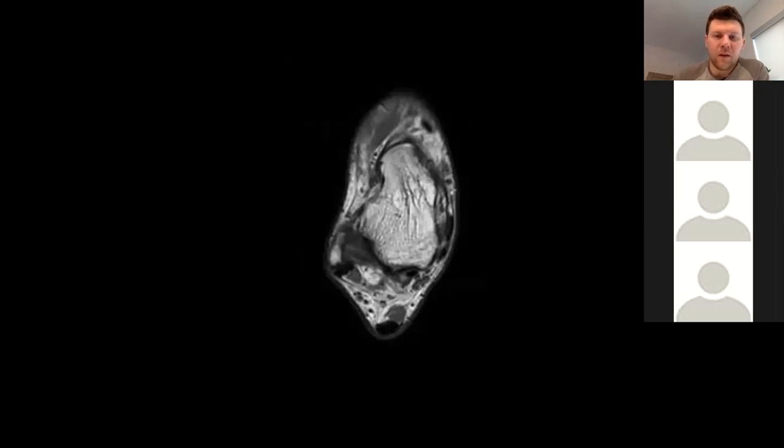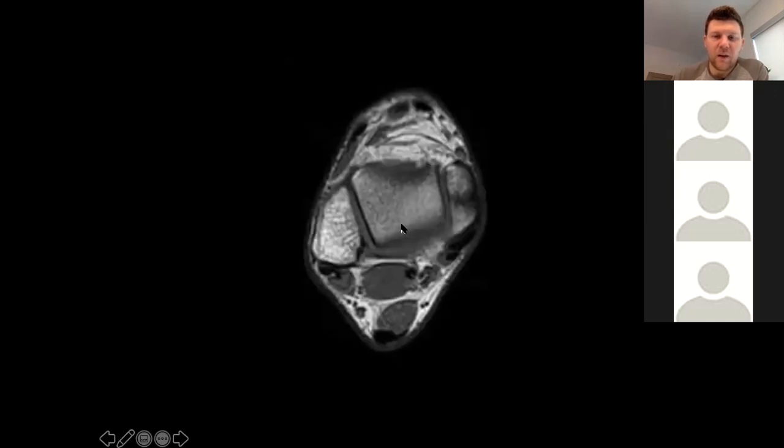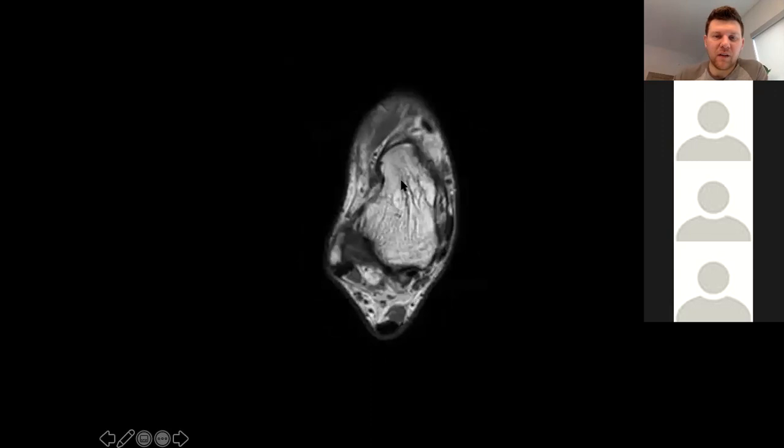I'll go. Okay. So which bone is this one right here? Calcaneus. I'm going to go back. So this was the ankle joint, right? Yeah. So you'd say this is an axial with a level ankle joint. What tendon is back here? Your Achilles. Okay, so does it look like that's inserting on the calcaneus yet? No. Okay, what would this be? The talus. Good. Besides the talus, what's the only other bone that you can see here?